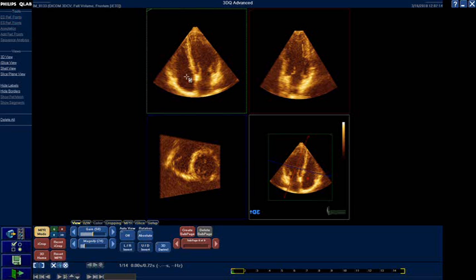I will click it, so the system will give me some points to put. S means the septal attachment at the base here near the mitral annulus. Then L, lateral wall, basal. Then A, the anterior wall, which is here. And I, the inferior wall, which is here.